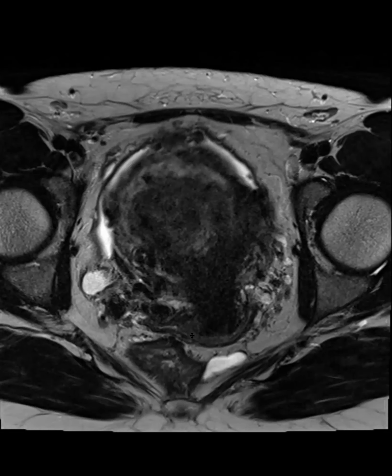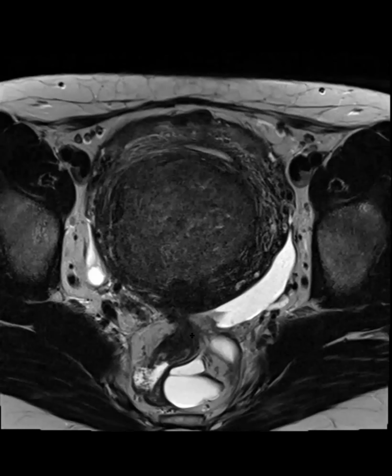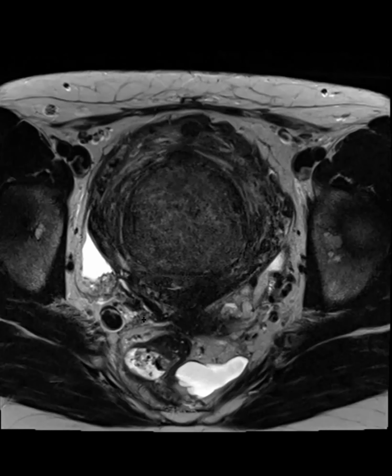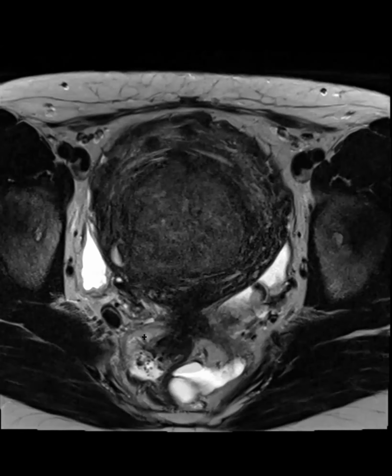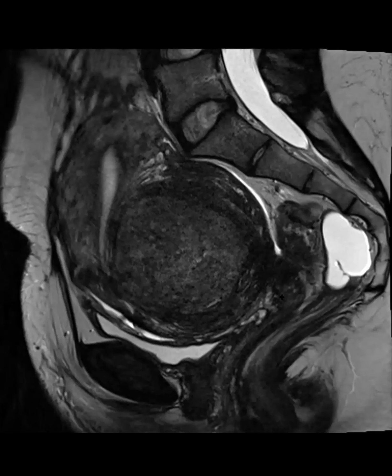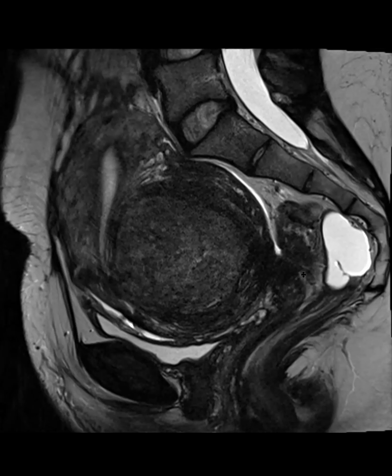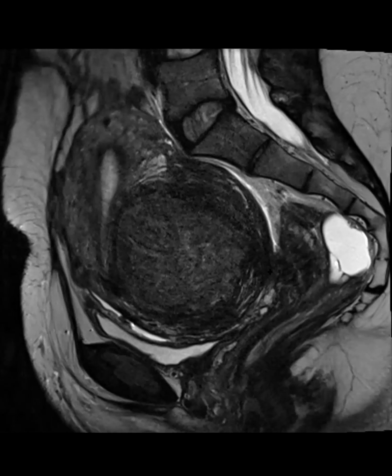It's very hard for us to see those, and that's okay because they don't expect us to see it, but it's cases like these that help direct their surgical approach and patient counseling, right? So this is a great example of the mushroom sign DIE that's infiltrative and involving multiple structures here. So this was a pretty lengthy procedure for them.